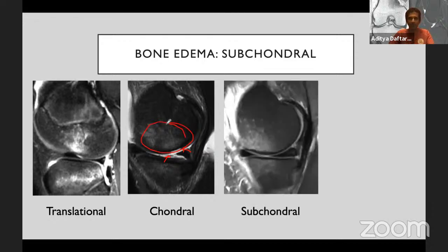because there can be a cartilage abnormality there. You can have these edema patterns here, which are, if you look at this cartilage lining here and you look at the cortical bone here, you can see this thin black line that I can draw with almost a pencil. But when you come to this area of marrow edema, you can see how it sort of lifts off and becomes almost lentiform in appearance, like a lens, instead of being this flat line here. And this is what we see typically with subchondral insufficiency fractures. And this is what many people mistake and call SPONK, or spontaneous osteonecrosis, which is essentially considered to be a term of the past now.